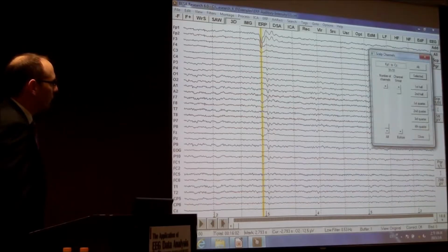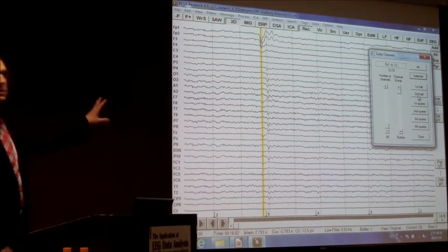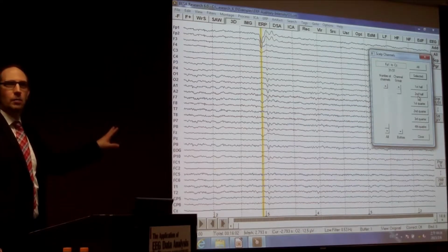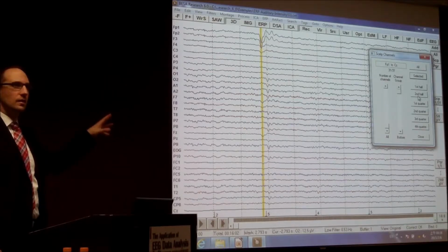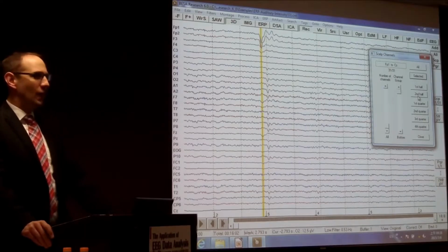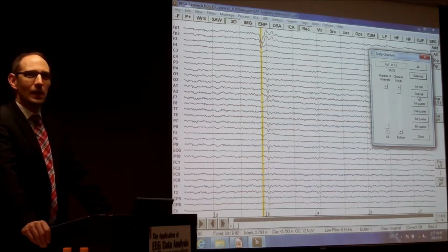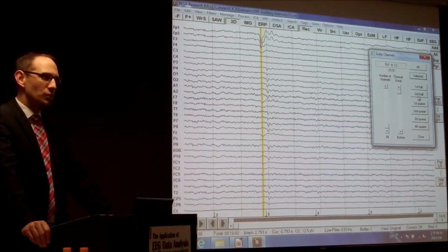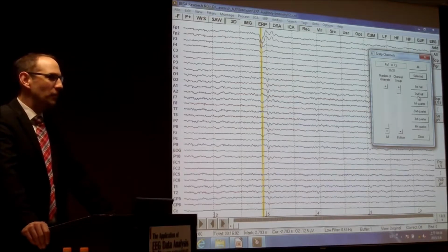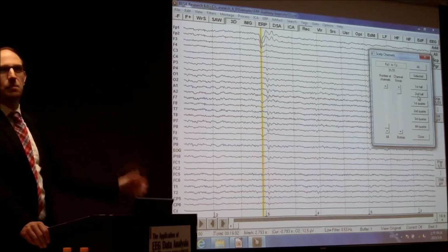Then what you have here, you have for the navigation. In this case, 31 electrodes, it's pretty easy to see. That's not a problem. You can easily go through the data, you can see everything, but imagine a data set of 512 electrodes. These kind of systems are available. Nihon Kohden from Japan is already producing such an amplifier with 512 electrodes. Then the screen is basically black.